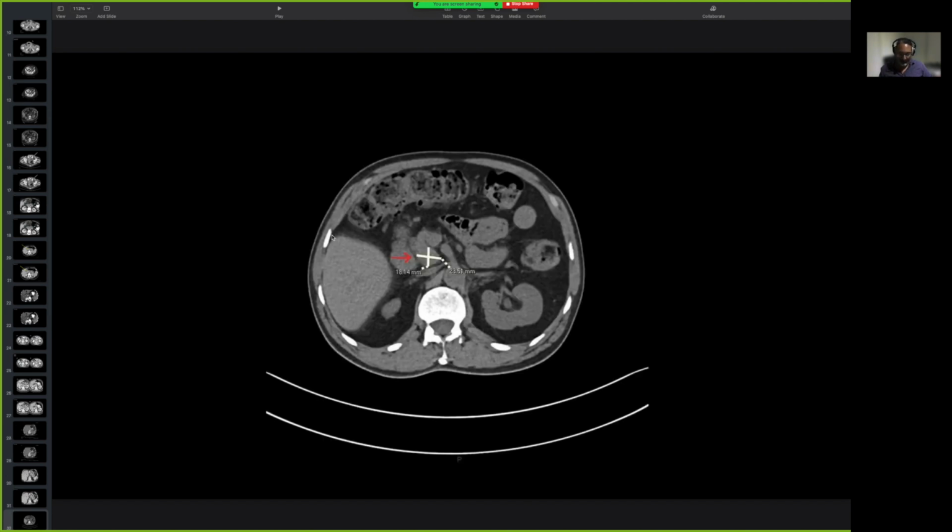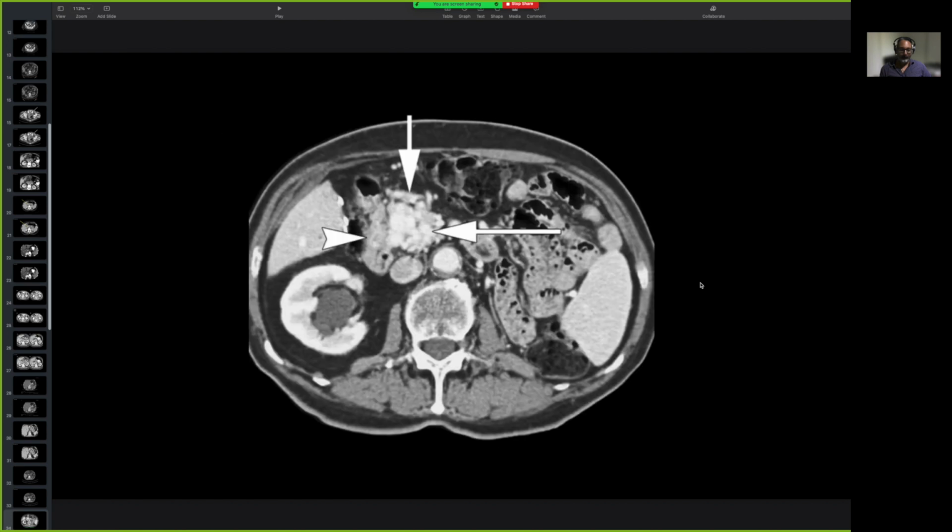Now here we're a bit lower down the liver, and I think this is trying to show that this structure here is the pancreas, and these would be peripancreatic nodes. I think I've got another one that shows the pancreas much better. Now that's a pancreatic mass.